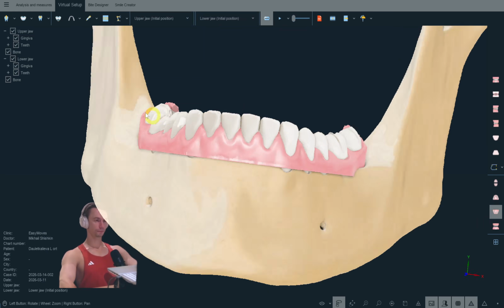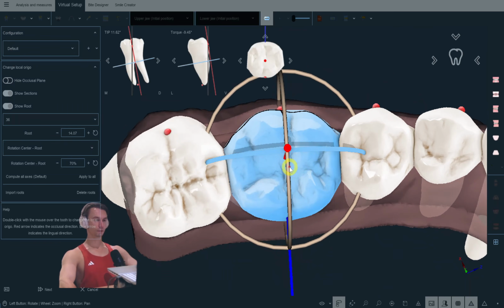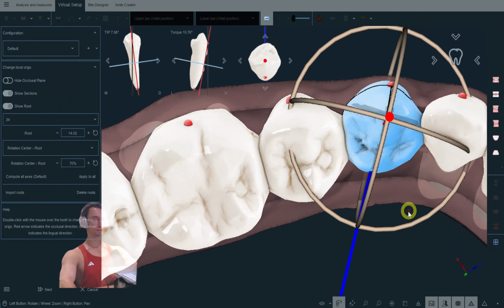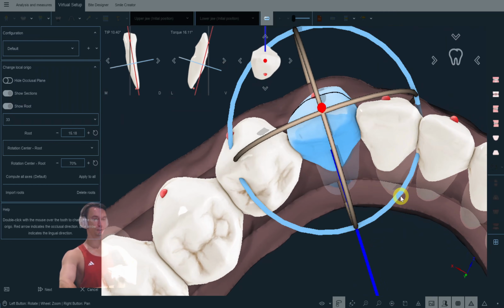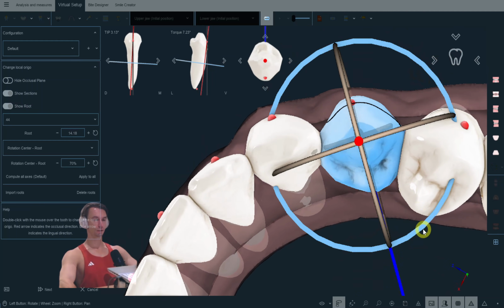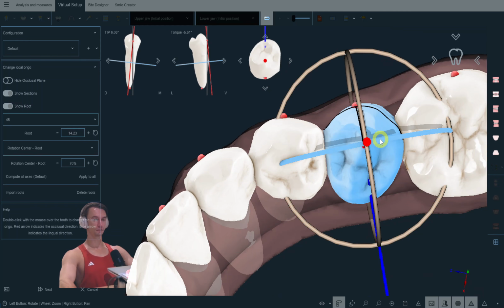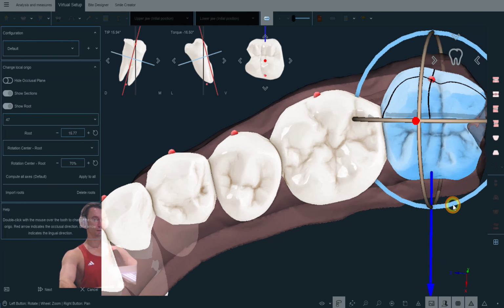And let's check the lower jaw. This is very important; it's always the place to start. My dental technicians do some preparations, segmentation, and CBCT superposition, and then they send me this file in M3D format for Maestro, and I check the roots.